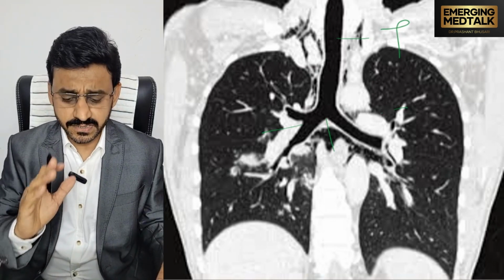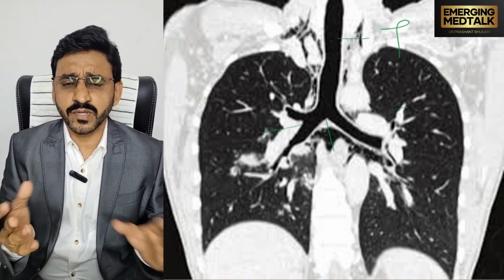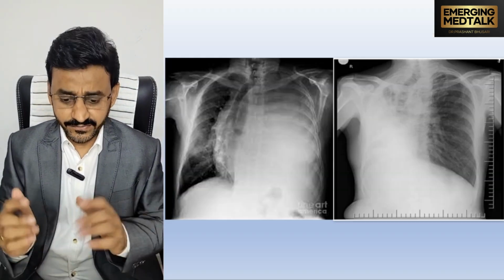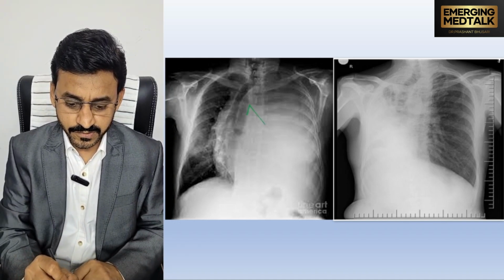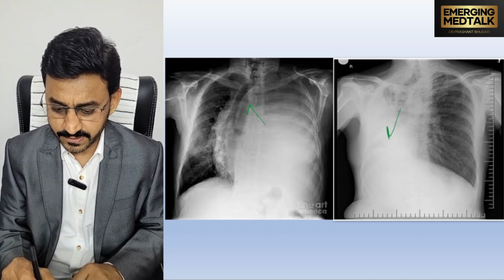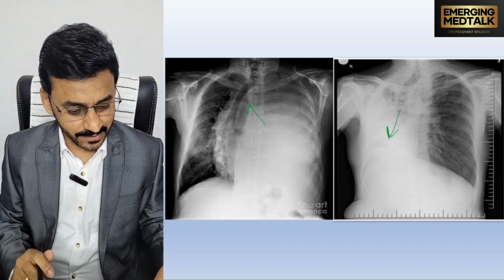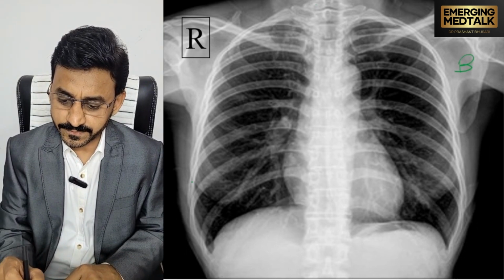It is midline, and around 10 to 12 centimeters in adults; in the neonate, the newborn, it may be around 4 to 5 centimeters. It may be pushed to the opposite side in pleural effusion, and it is pulled toward the side of volume loss, that is, collapse of the lung. So this is the airway. Second will be the bones.